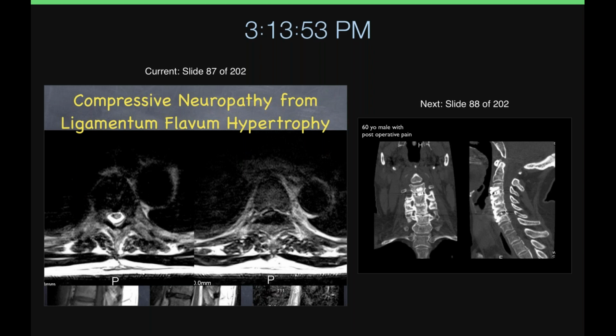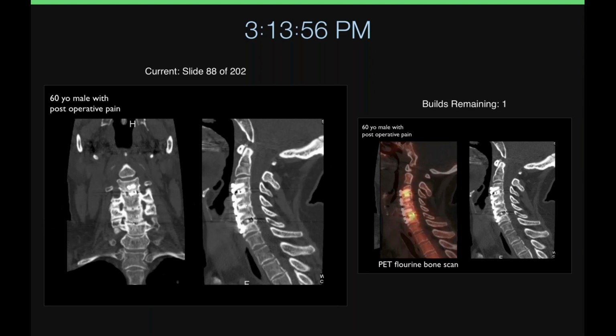It's also calcified, probably. This is probably calcified too, right? Okay, who's next?